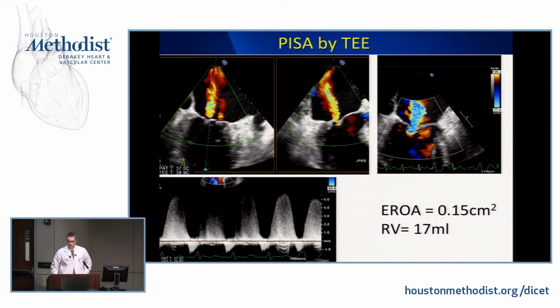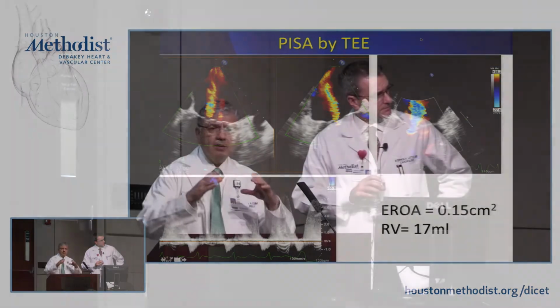I'm going to talk through this because otherwise people are not hearing us, if you don't mind. It took quite a few conference calls to decide where you measure it. Well, you see this hemisphere like this, okay?